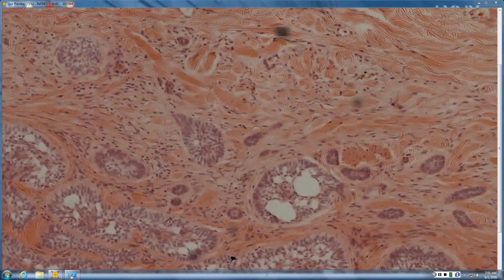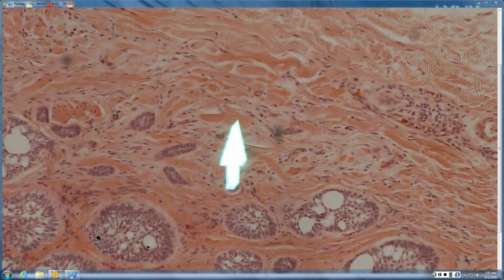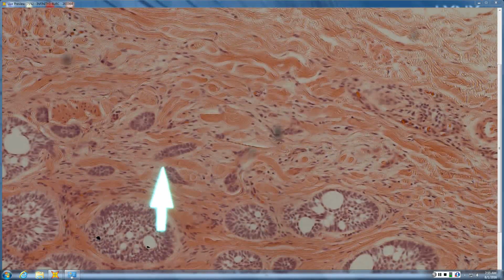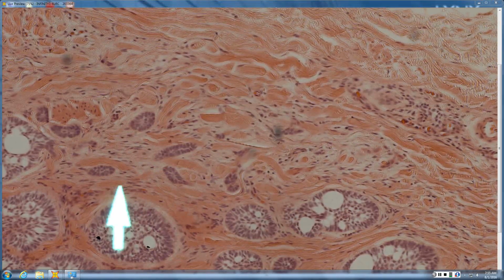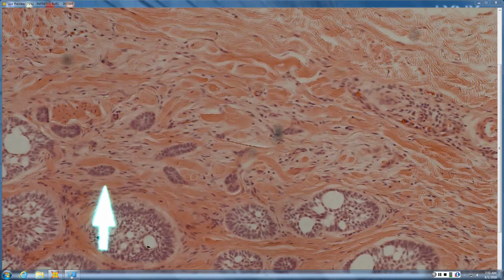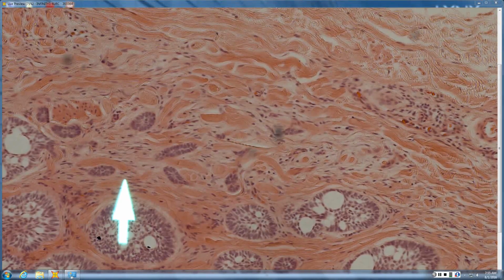What else about its growth pattern? Somewhat infiltrated down at the bottom there. Yeah, is it spiky or more little round to oval islands? More little round oval islands. And are they all within a fibromyxoid stroma, or are they between pre-existing collagen bundles? Yeah, I do see the collagen bundles in between, some of those smaller. And with that, it's like a micronodular.